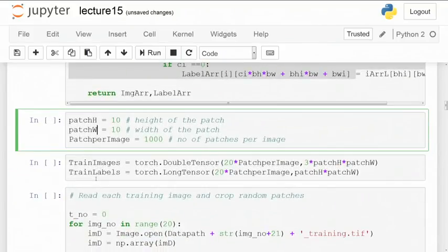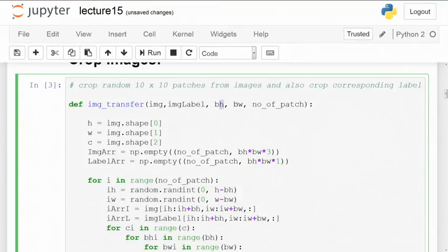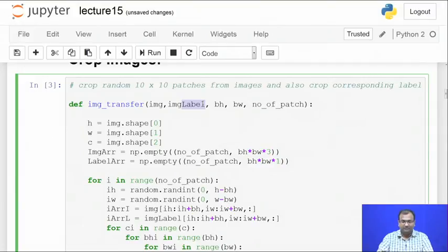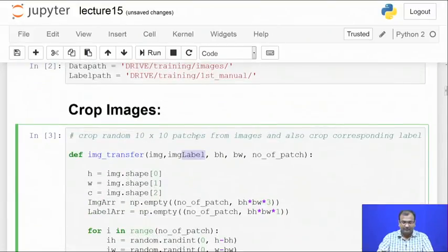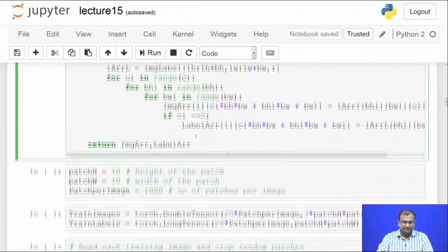Now here, if you clearly see, this function does not have 10 cross 10 explicitly mentioned anywhere, because I am just using some relative numbers and some container or reference variable points in order to get my actual bigger sized image of say 512 cross 512 pixels.